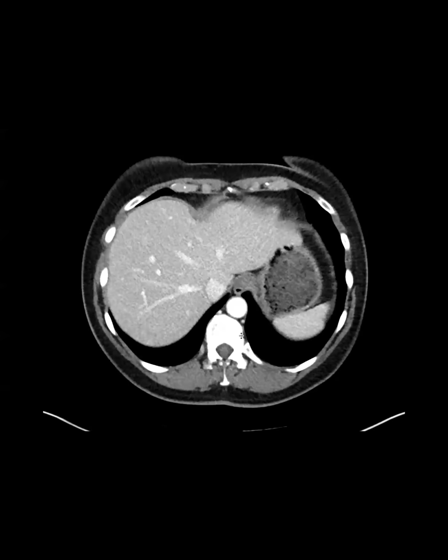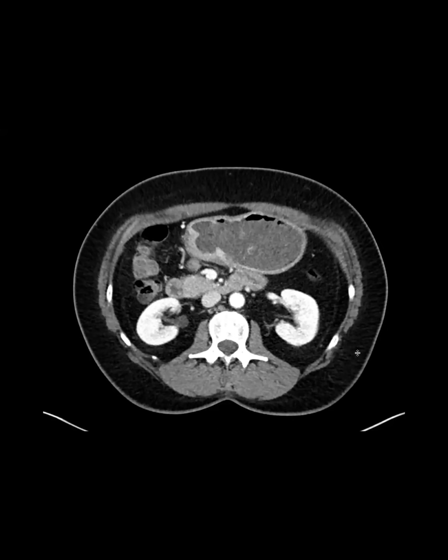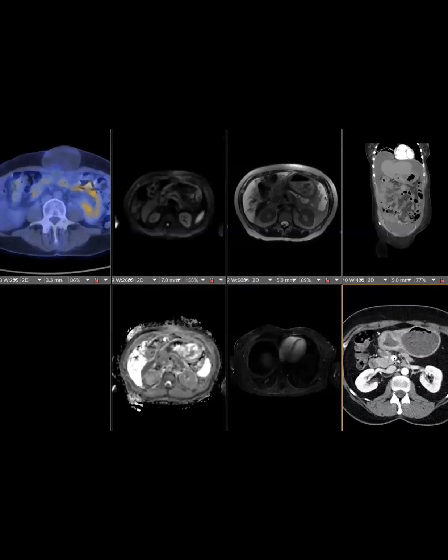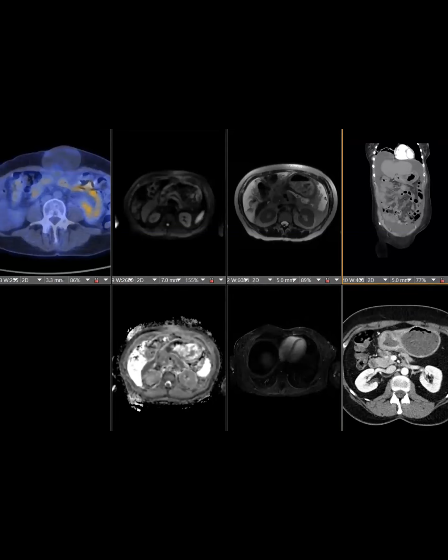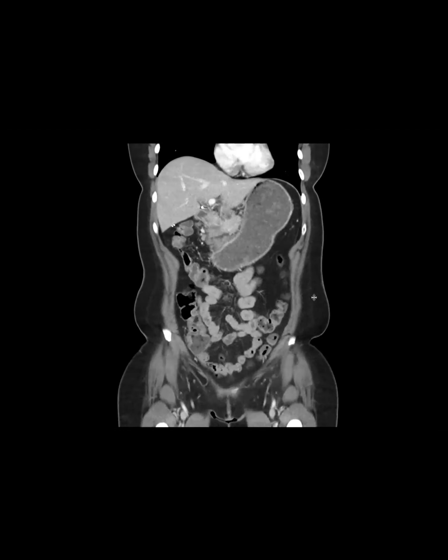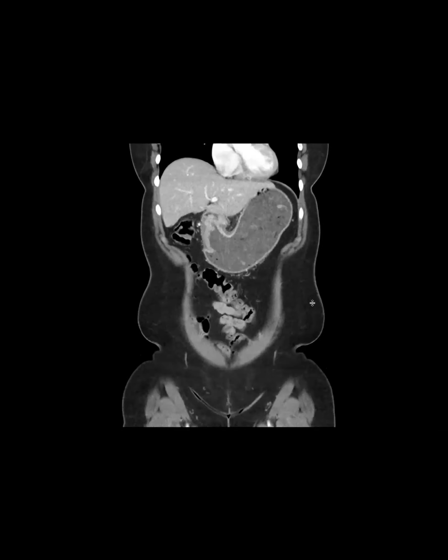Great case. Okay. This is a pre-treatment scan for gastric cancer. I feel like there's a circumferential thickening of the antrum. I'll show you the coronal on that. And it's a nice gastric protocol with nice distension of the stomach. Either that or it's gastric outlet obstruction. I think probably the latter.